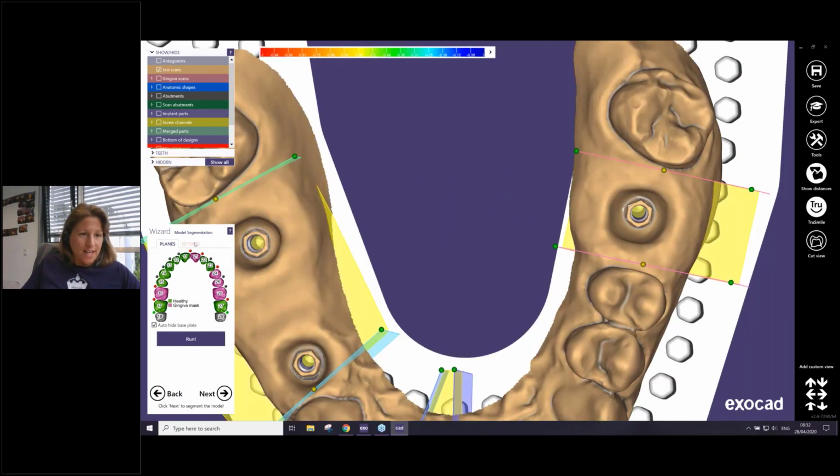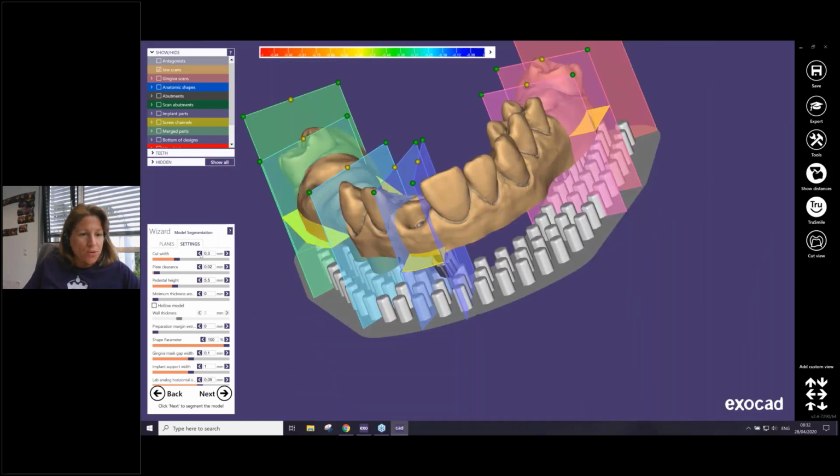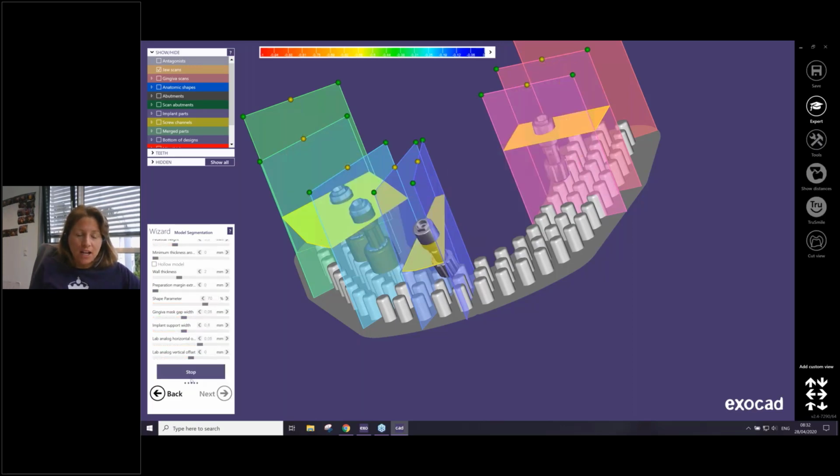Okay, so with the settings, here we have all values for the cut and also the settings for the height of the base and so on. Here I will directly start with the calculation, and then I can explain you some settings.